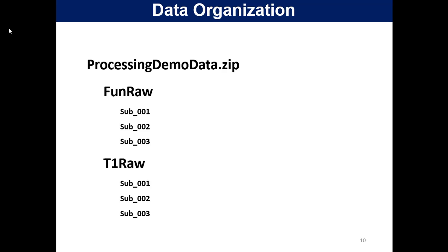What you need to do is firstly organize your data. Once you get the data from the scanner, you organize it into a certain format, and after that, you just single click, click run in DPARS, and you can get all the measures, and later perform the statistical analysis.